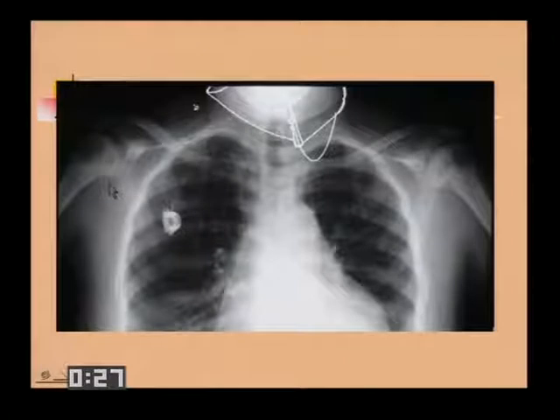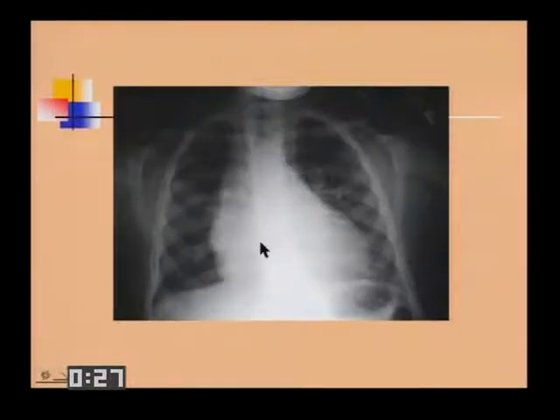Other causes of avascular necrosis in childhood could be a child who's already had a renal transplant, or as in this patient, a child with sickle cell disease, a late teenage child. These same patients can have a large heart due to a high output failure. If you see an area of infiltrate or atelectasis in a patient with bony changes of sickle cell disease, you do have to worry about acute chest syndrome.